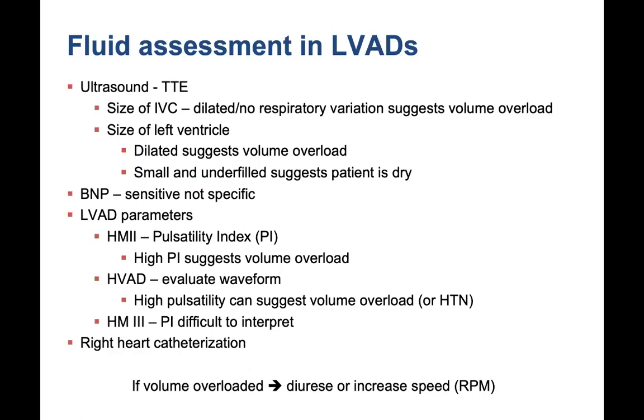So fluid assessment and LVADs. I know in the CT-ICU, you guys are often seeing LVADs, and this is one patient population where you would be particularly interested in assessing their fluid status. Of course, we can look at ultrasound or transthoracic echo. We can look at the size of the IVC. Is it dilated? Does it have respiratory variation? Of course, if it's dilated and doesn't vary a lot with respiration, that might suggest that they're volume overloaded.